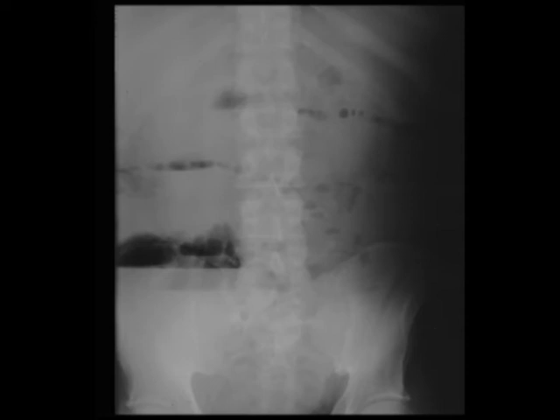So those indicate that the small bowel loops are fluid filled and the little air bubbles are floating superiorly on top, and they give you that string of beads appearance or string of pearls appearance, which is a good indication on an x-ray that you have a bowel obstruction with significant fluid and distension of the bowel.